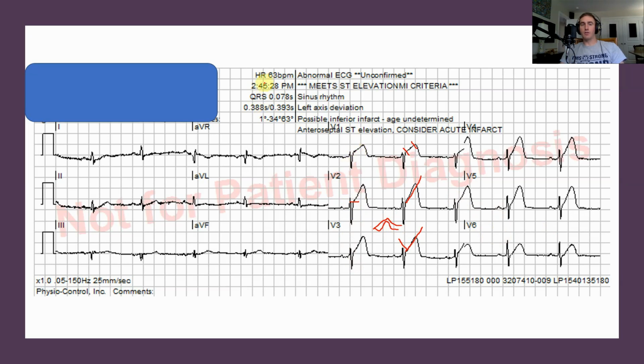The heart rate was also low. And you have ST elevation in V1, which is pretty atypical of an anterior STEMI, unless you also have right ventricular involvement, because V1 is a right-sided lead.